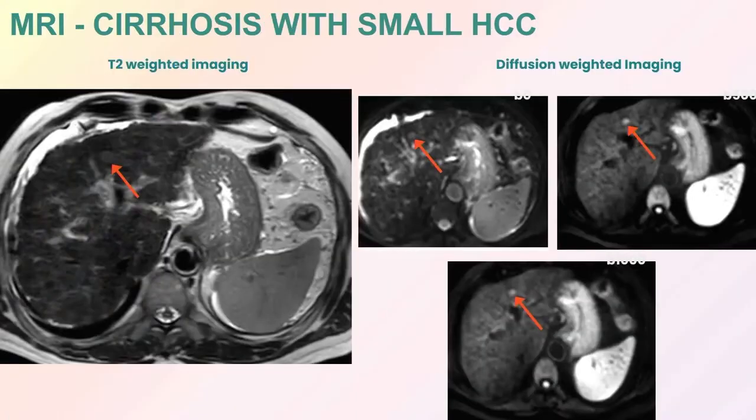Now my next picture is... yesterday Dr. Joy Varghese was saying, about when we have patients who have associated renal impairment, and he was talking about the renal impairment, but invariably that becomes a problem for us because you can't give contrast for CT or MR. So what do we do? Quite often a plain MR with the T2 and diffusion images really helps in problem solving.